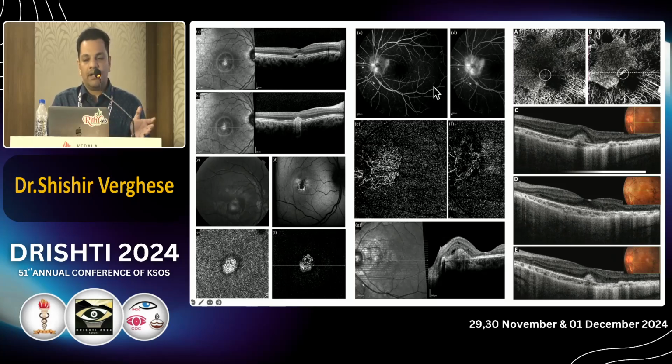Also in inflammatory conditions, VKH, you can have peripapillary CNV. So this is a peripapillary CNV adjacent to the disc, and this is post-treatment. You can see the regression in the network of blood vessels. So this is another CNV seen in a choroideremia patient, which was post-treatment. It had crumpled and become like a fibrotic scar there.